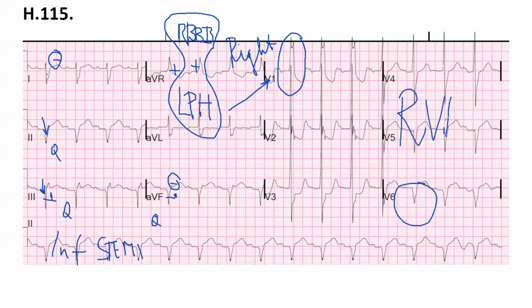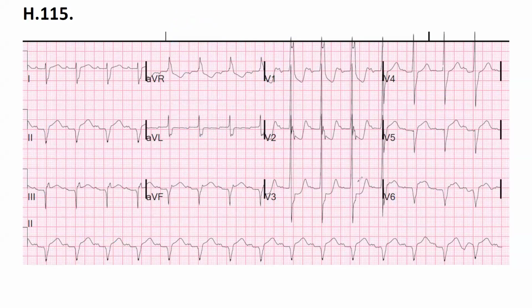Is it hypertrophy? Yes, it can be a right ventricular hypertrophy. I have a quick question, because we had a first degree AV block and a trifascicular block. Yes. Okay, thank you.